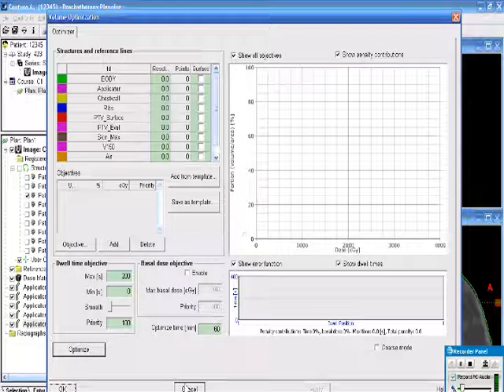Now, one thing I want to mention before we start this is that we're going to create some markers that are actually used in the optimization. We're also going to create some markers on this DVH graph here that are not used in the optimization itself, but we create them in this graph so that when we're making the trade-offs, we can see how we're doing. The V150 and the V200 fall into that category.